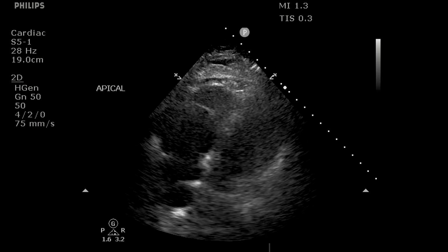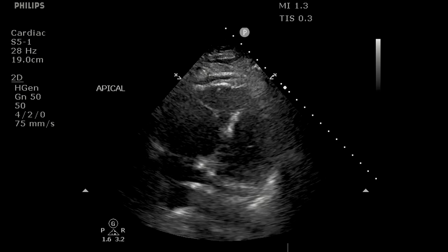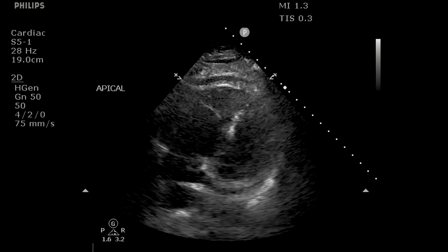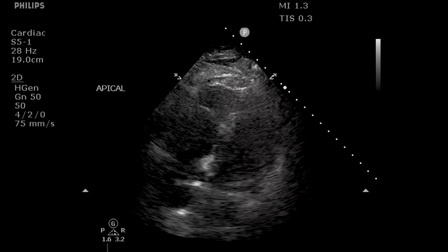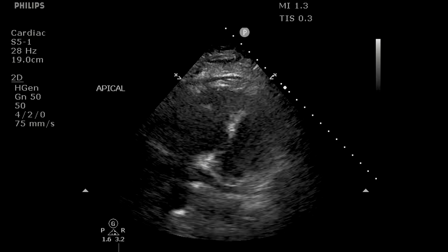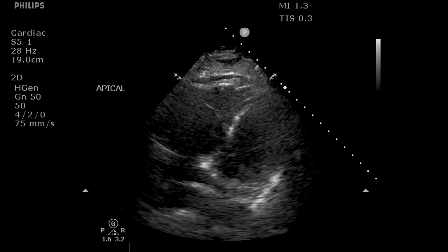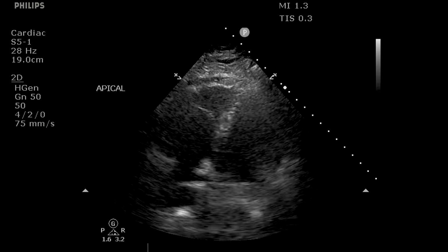And you look at it and the patient's tacking away at 110, 120, 130 beats a minute, right? And so it's fast, but when you slow it down and look at the actual chamber size difference, right? There's not as much chamber size change as you would want to see for a hyperdynamic patient, right? And so tachycardia is a great masker of a low ejection fraction in this visual estimation technique.